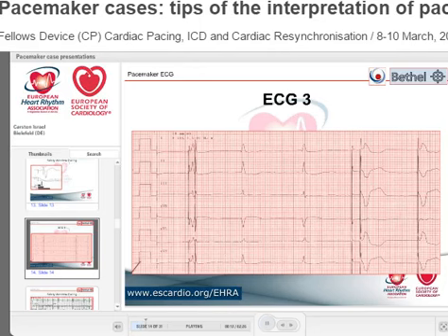No, it's not switch. Leads are, sometimes we look what we fix where. Yes, very good. Somebody said that you have 2 spikes here and 2 spikes here. And obviously the difference is these spikes are very close to each other, 110 milliseconds, and these spikes are much more apart, 180 milliseconds. And I can assure you, we were not reprogramming the device in between. So this must be an automatic algorithm. There's no other way. It must be automatic.